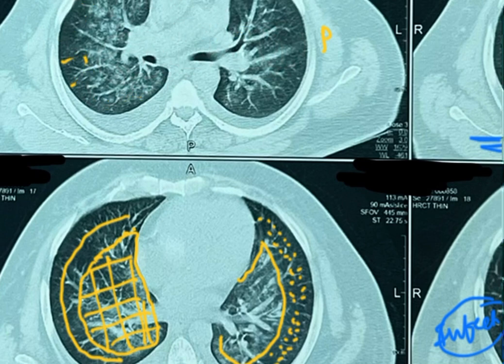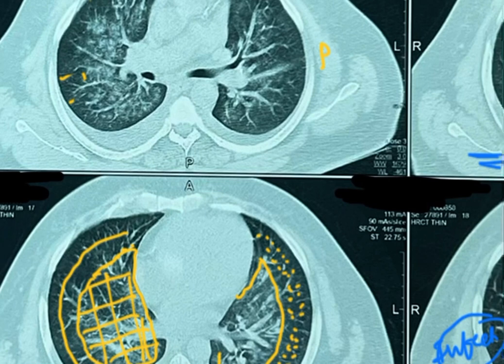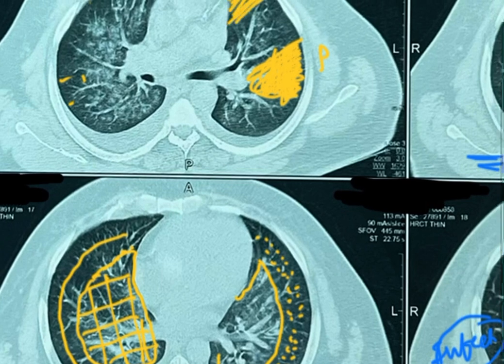Apart from that, a consolidation is almost always dense, means you won't get this type of consolidation. Consolidation or pneumonia is usually very much dense, and it will only involve one part of the lung. Usually it will involve one patch or one part of the lung. So this will be like pneumonia. If it is multilobar pneumonia, it may involve multiple lobes, but it will be in a continuous fashion, and it will involve usually from base to apex or from the periphery to center. So it won't simply involve only the central part usually.